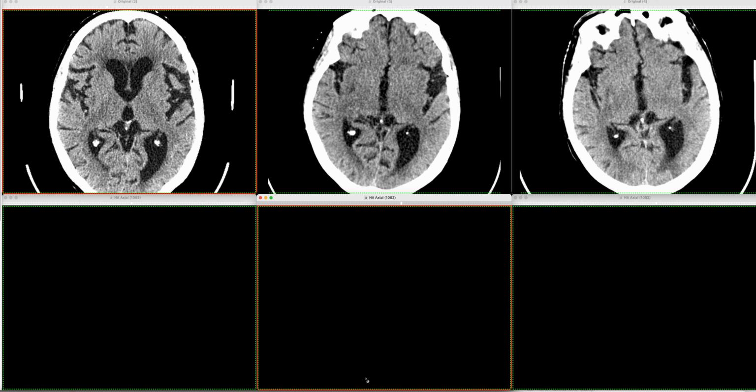I'd like to share a software project I've been working on that's been FDA cleared and is licensed. And I think it's one that really ups your game for the lowly head CT. The product is called NeuroAlign. And I'm going to start by showing you one case.